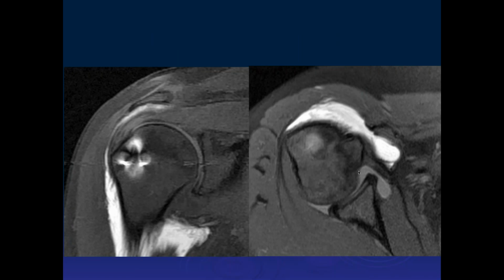Well, why do you say that, John? What's all that fluid down below on the left image? Oh, this is fluid that extravasated down in the subacromial subdeltoid bursa, and it just extravasated distally. The injection itself was up here higher, but they forced contrast under pressure into the subacromial subdeltoid bursa, and it decompressed distally into this area.